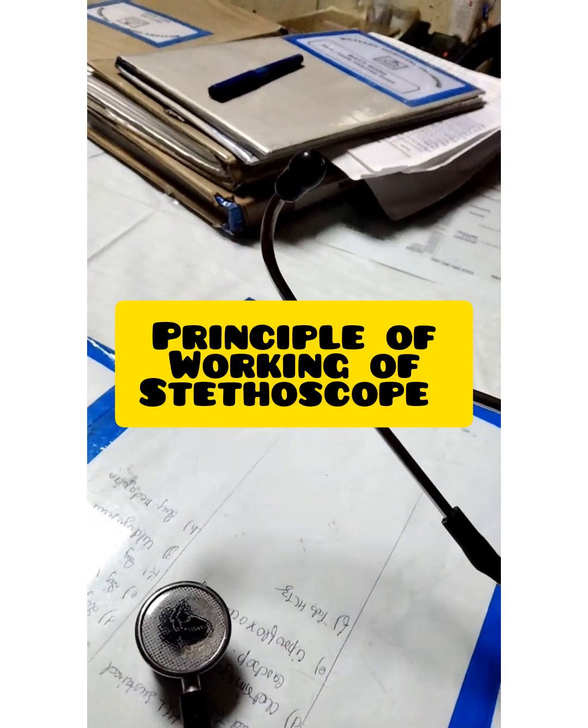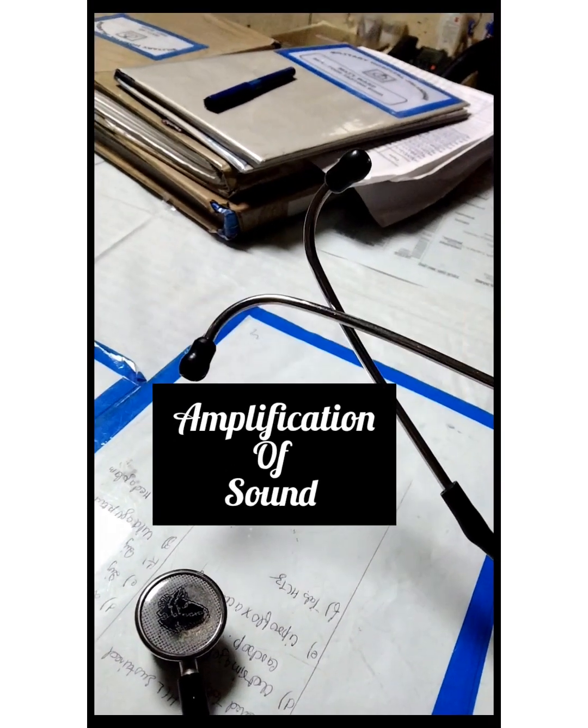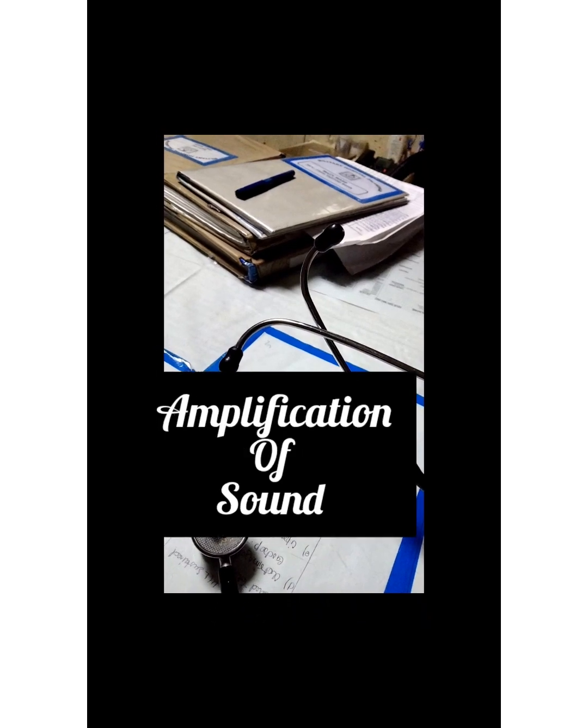Third point is principle of working of stethoscope. So the principle behind it is amplification of sound.